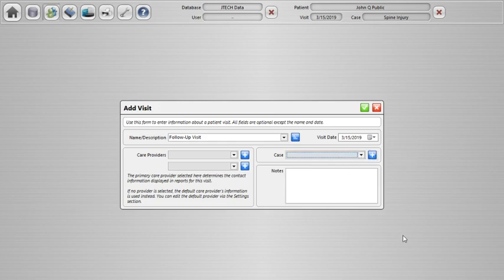You can actually leave it so it's not tagged at all, so that all new exam dates are simply added and aggregated together. And this stuff can also be changed on the fly later on as well, where if you need to start tagging a case after the fact, that can actually be modified, where before it was locked in the software. So case files now are tagged onto the visit rather than being a required element of the basic record itself.